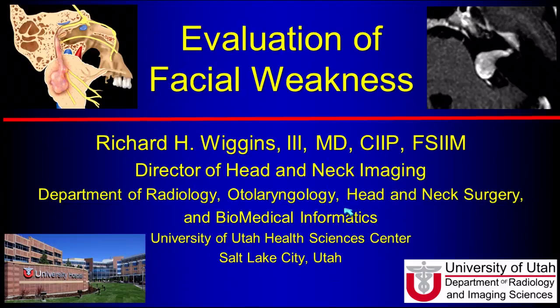So I'm going to talk about facial weakness. As you've heard with all these cranial nerves, we're thinking about imaging from the origin nucleus out through the end organ. If we have a patient with a whole bunch of problems, we're not thinking about the isolated cranial nerve. But in the patient who has an isolated cranial nerve deficit, we want to think about imaging from the origin nucleus all the way out through the end organ every time.